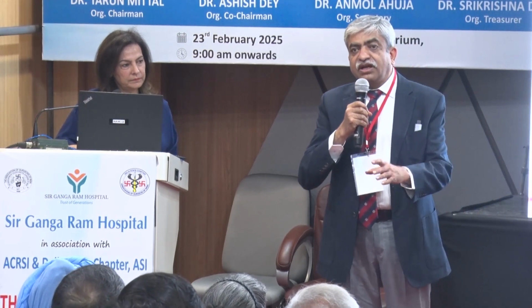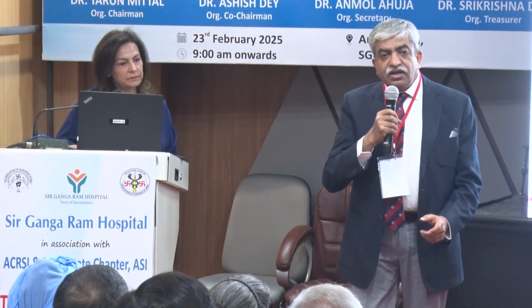But yes, at times, surprises, as the madam said, may come. Once I thought it was a simple horseshoe-shaped fistula. When we got the MRI done, it was a bilateral synchronous intersphincteric fistula. We were thinking it was a transsphincteric horseshoe-shaped fistula.